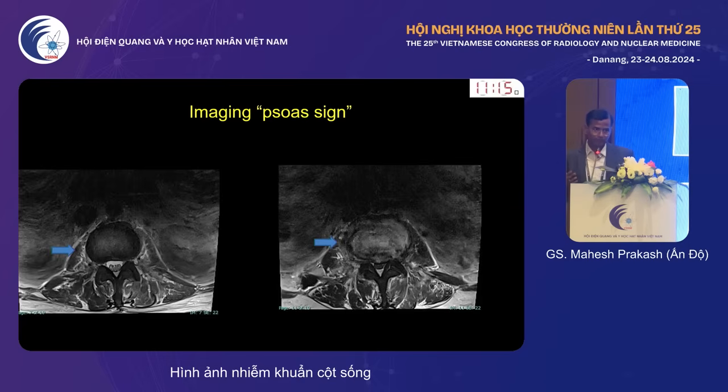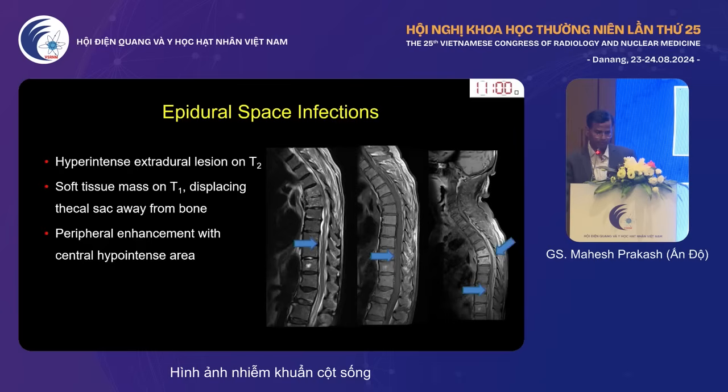That is simply the psoas sign. This is a wonderful sign you can use in your clinical practice to differentiate infection from degenerative disc disease, because many times degenerative disease can mimic infection. So this is one of the important signs which you can use.